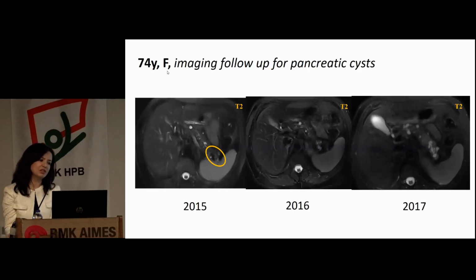A very interesting patient. Some pancreatic cysts were detected during imaging of a patient, an old lady. Follow-up was recommended. On the first year of follow-up, radiologists reported that everything is stable. So routine follow-up is enough. But there was something changing there. Please concentrate on the tail portion of the pancreas. There were newly appearing retention cysts, actually, and secondary ductal dilatations.